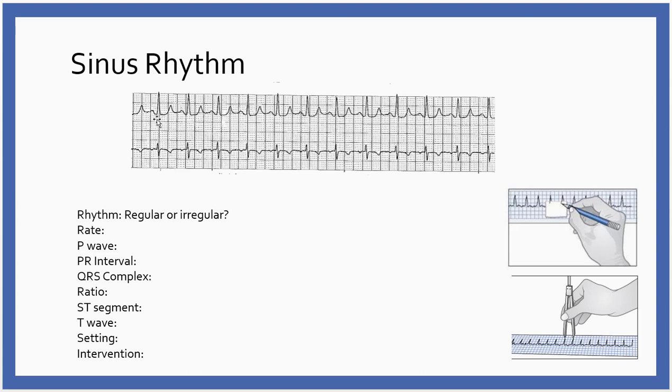And like I say, don't try to count baby boxes because it'll drive you bonkers. Take your little piece of paper and line it up and put a line on the paper where the QRS begins, and then another line where the T wave ends. Or excuse me, we're measuring QRS. Where the QRS begins, well, we already measured the QRS.